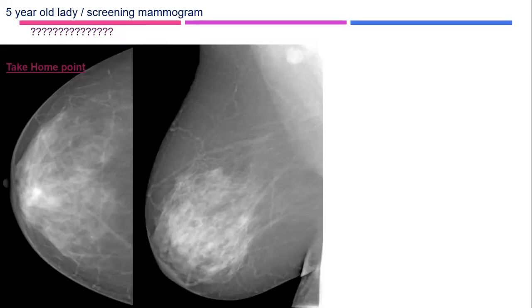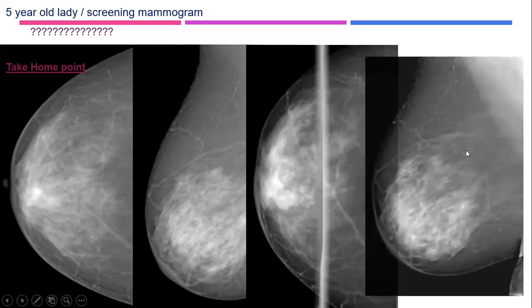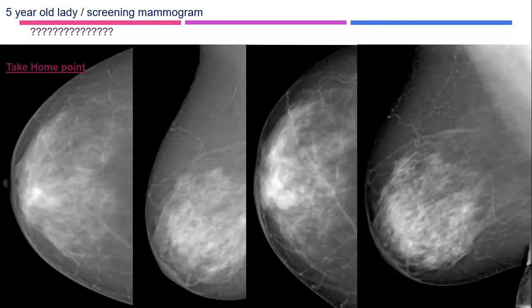So I need a compression view. Nothing was done for this lady, and she came in for the second round.